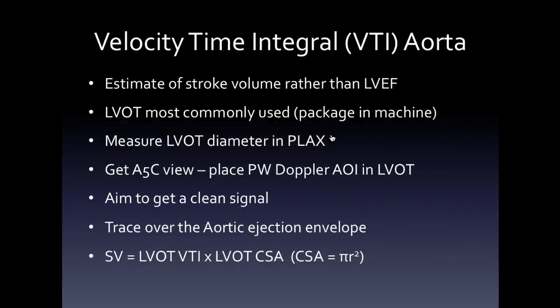The VTI is talked a lot about in the intensive care literature, and it's talked less about in the cardiac literature. I'm not quite sure why that is.